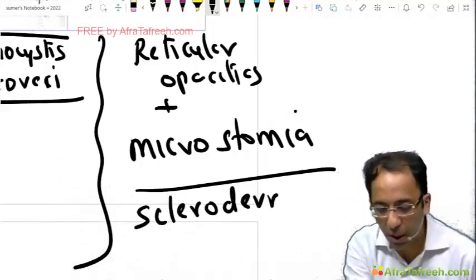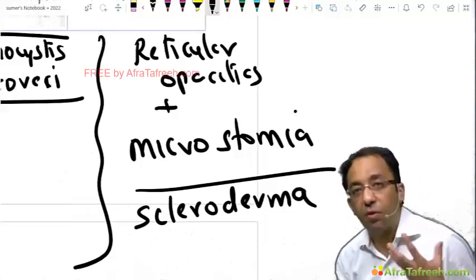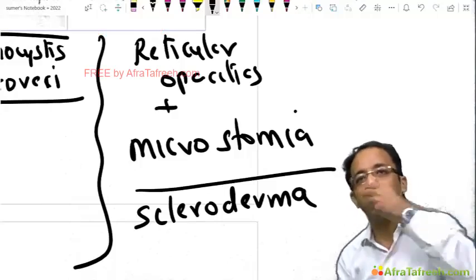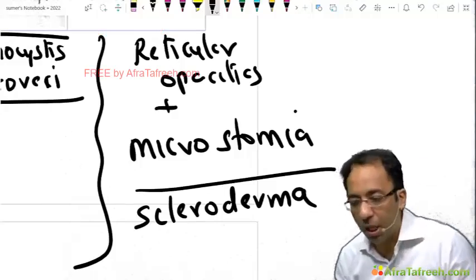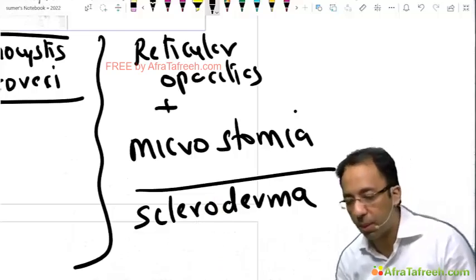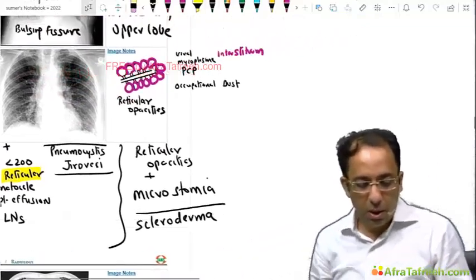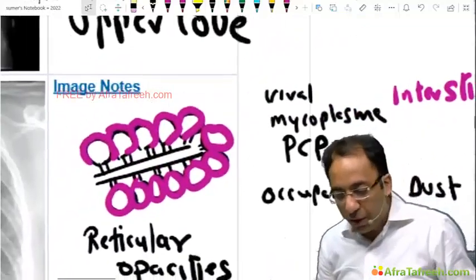Very good. I think Sahil Arora got it first and Ankita also got it. Very good. And then you think of scleroderma as the cause of ILD. ILD with small mouth, we think of scleroderma. And this is a typical question that has been asked in your central institutes in the past. Okay, very good. Now I will take you further into the concept.